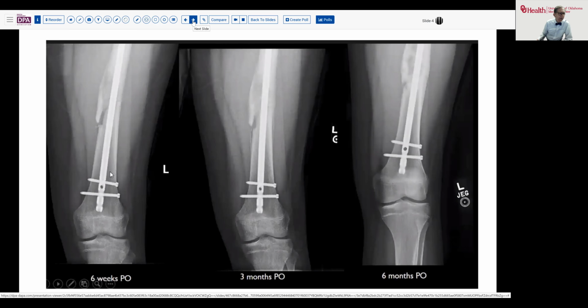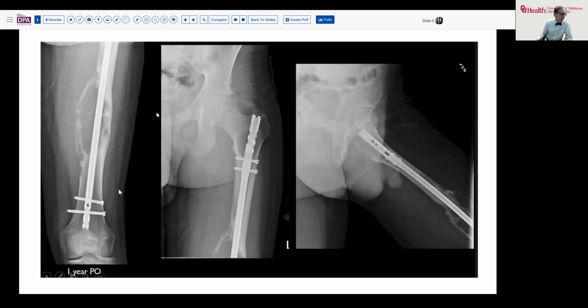So they tell him to come back at a year, and lo and behold, the next radiograph we have tells a totally different story. Because now we see not only do we have expansion on the lateral side, but we have expansion medially with lysis and destruction of the bone and additional defects that appear subsequent to the process. We can see this extends upward towards the shaft here. We don't know how far it goes, but we can certainly now raise the question of what is this?